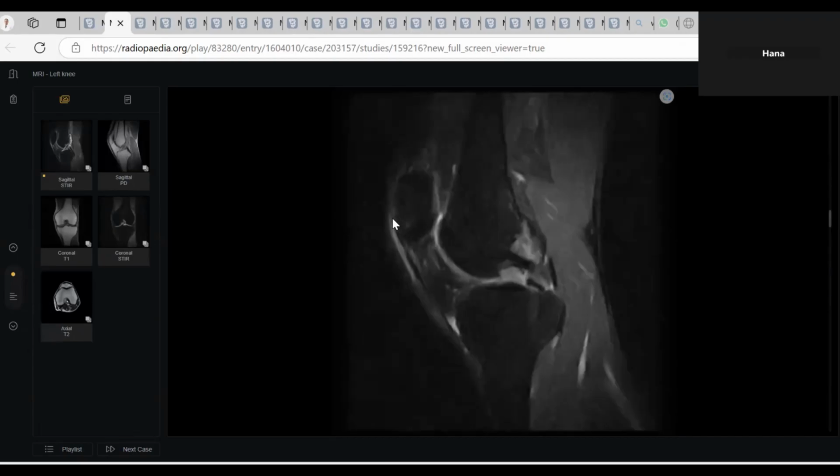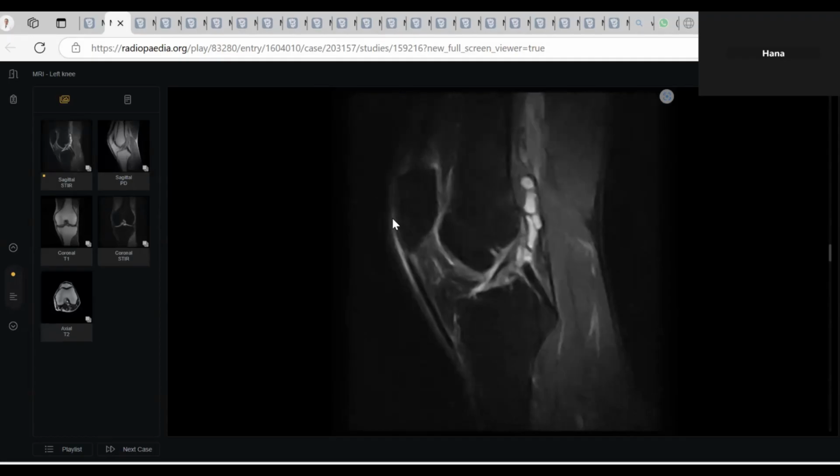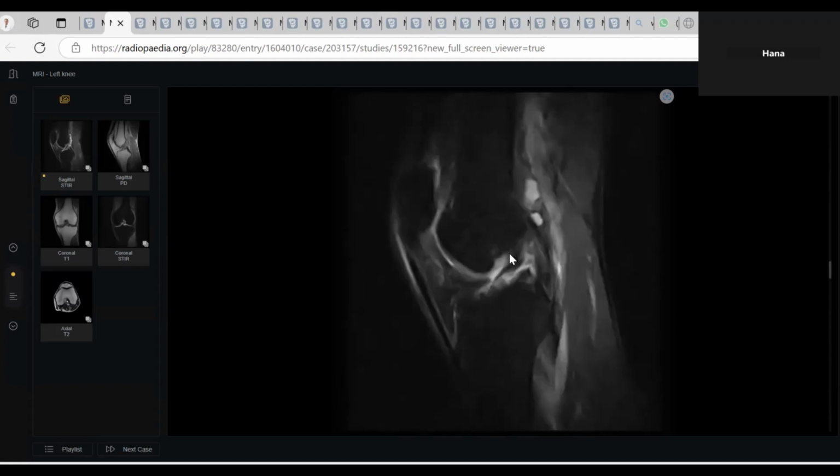This one also is a tricky case. This is an ACL ganglion cyst associated with ACL abnormal signal, which is a mucoid degeneration. What should we do? We should ask for a history of trauma. Why? Because mucoid degeneration has a conservative treatment. ACL sprain may need surgical or arthroscopic, through the endoscopy, treatment. Two different ways of management.